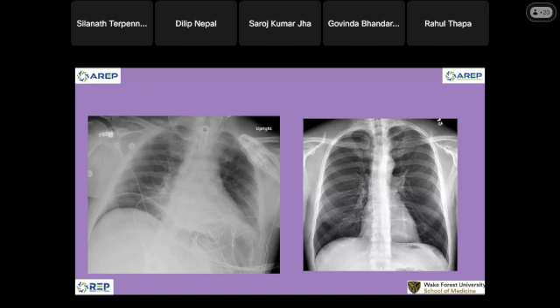We should look into the SVC. At the moment, there's no SVC obstruction yet. It's still patent. So this is lung cancer, adenocarcinoma. This is a lung cancer. Does the patient have a medical record? Did the patient have recent abdominal surgery?